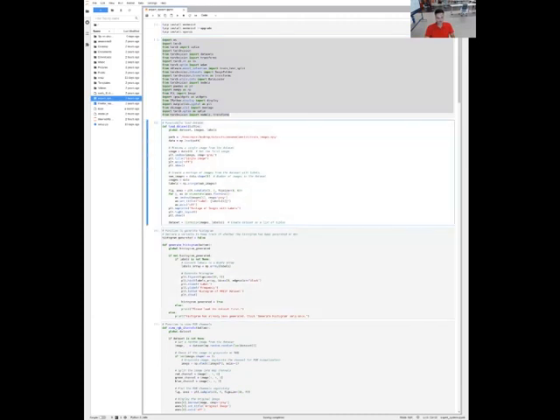This is the first section of the code, which is responsible for loading the pneumonia dataset. The function load dataset is used to load the dataset from the specified path, which is given from file.